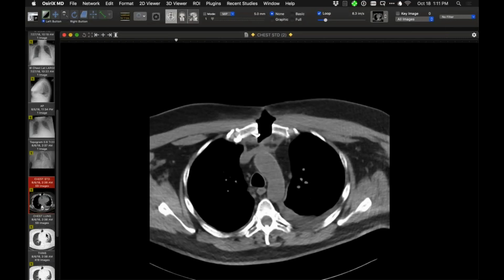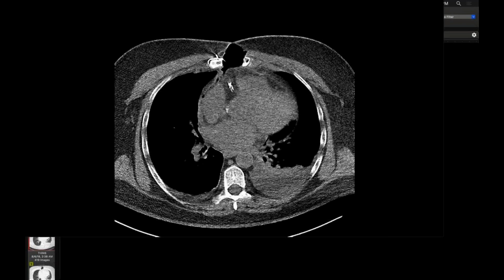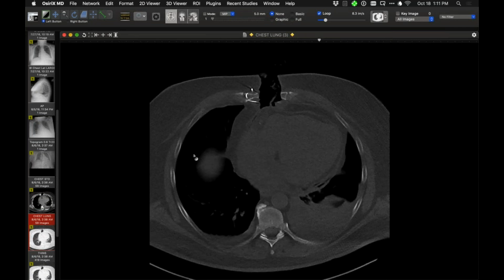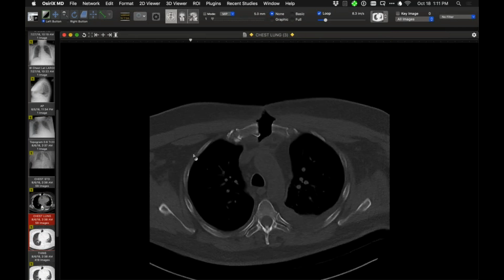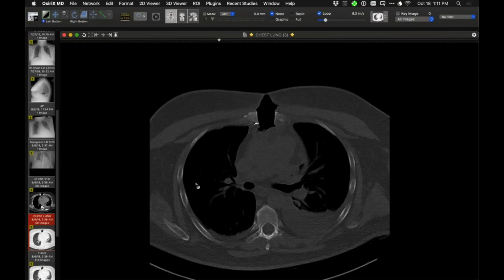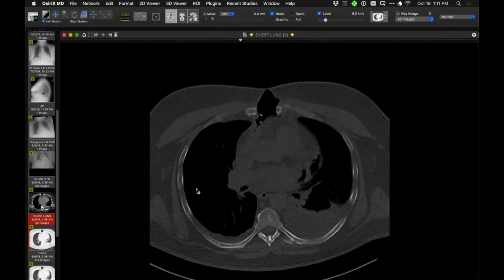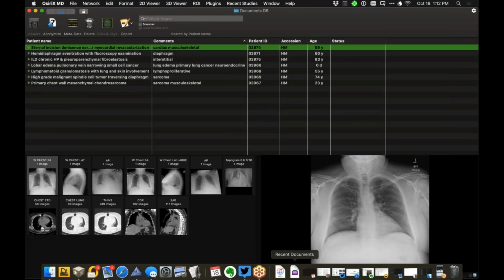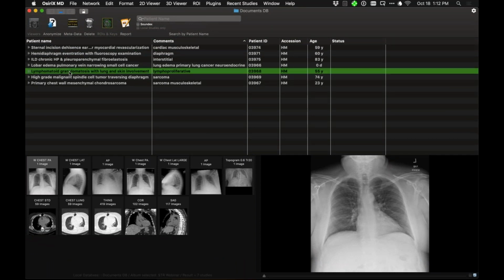Yeah, obviously that first radiograph from the 27th is very subtle. But that's what you look for. And I've never seen a wire that fractures in the acute setting. Usually the wires don't fracture until years after the sternum is healed. So like you said, it's the separation and the malalignment that you're looking for. Yep. And they just basically drag out of the left side in this case. Yep, pretty dramatic. Early separation.